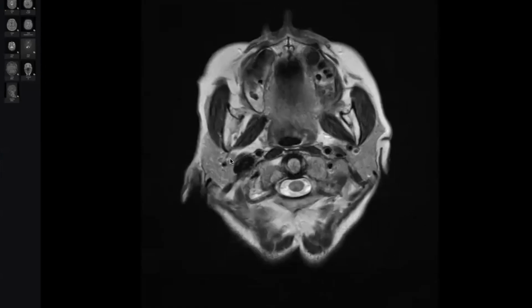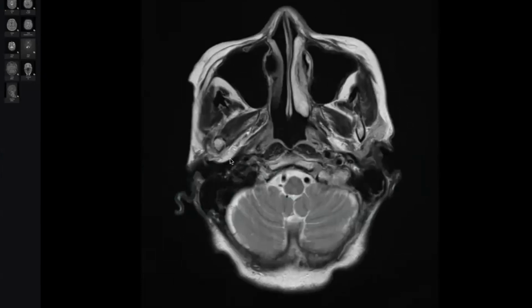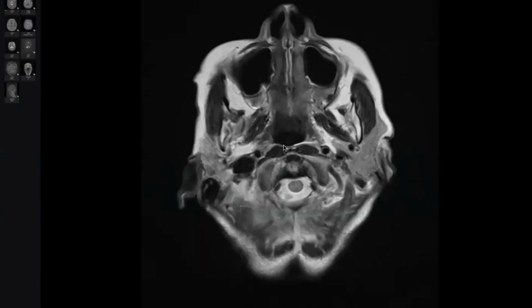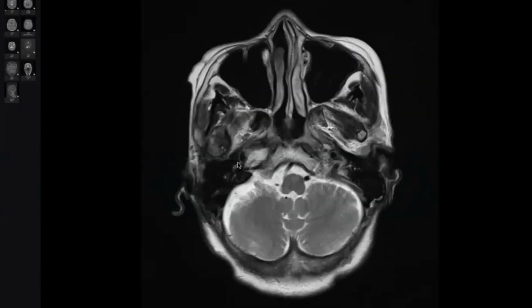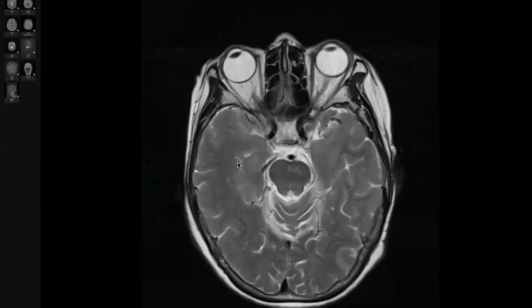Look at the review areas, and start from down. Look at the skull base, including the vessels. Very critical, including the foramen magnum for any crowding, including the clivus, including everything. My eye is concentrated on the vessels here, only in the review areas.